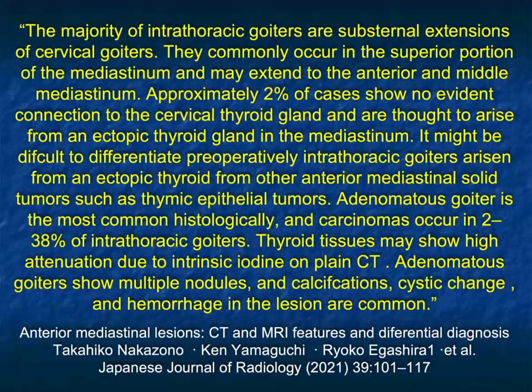Most of the time with the thyroid, it's a very obvious process. Sometimes the thyroid extends substernally, could be on the right side or the left side or on both sides. It tracks down from the superior mediastinum down to the anterior mediastinum and sometimes middle or both anterior and middle. Sometimes you can't really connect it to the thyroid gland, and so it can be somewhat challenging.